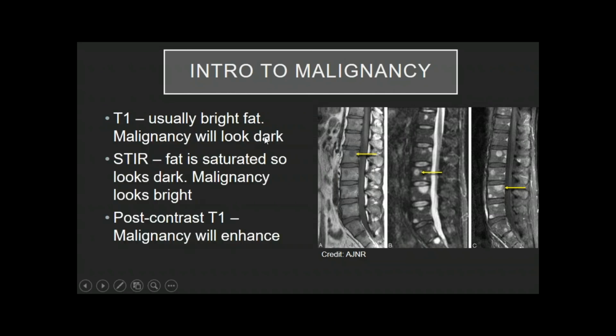All right, so again, T1, usually bright fat. Malignancy is going to look dark. On STIR, the fat is saturated, so it looks dark, so malignancy oftentimes is going to look bright. And then on a post-contrast T1, the malignancy is going to enhance.